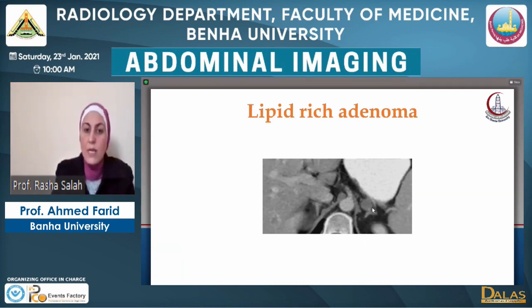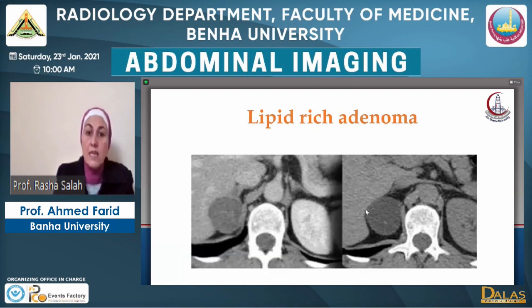This is a small left adrenal mass. It shows hypodensity in this CT study. It could appear as if it looks like a cystic structure. But on the portovenous image, it has some enhancement, and this makes it not just an adrenal cyst.